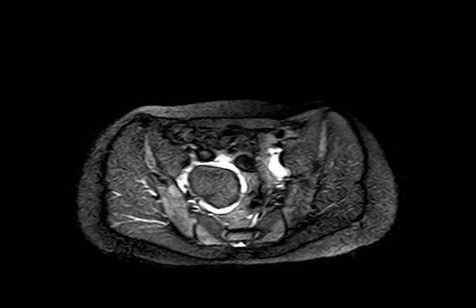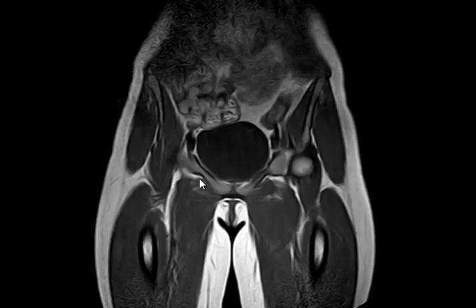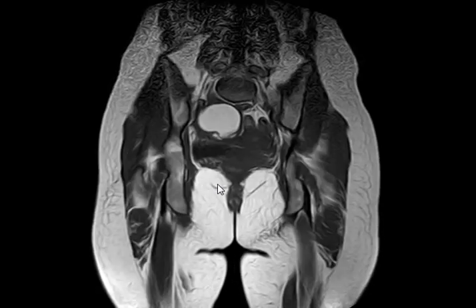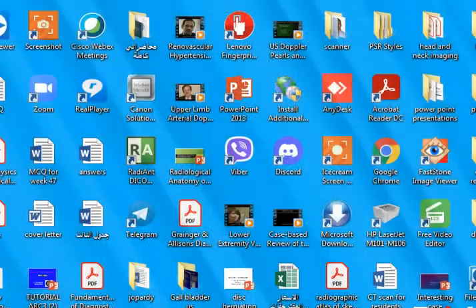Yeah, on fat saturation it's hypointense. Well, it should be, not always, not 100%, but if you see more solid component, more irregularity, more heterogeneity, of course other lesions, this is more in favor of immature cystic teratoma. Okay, good job.